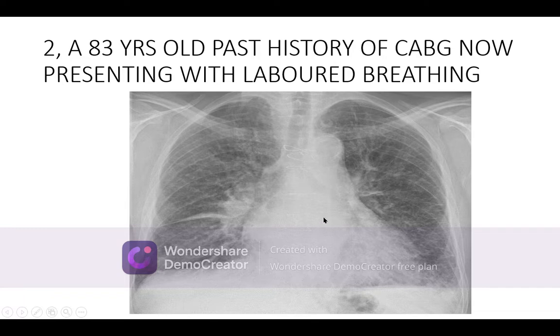It may become a complication of hypertensive heart disease. The cardiomyopathies can cause this condition. I mean to say that this is very clear cut. It is the cardiogenic pulmonary edema which is visible. Like the hilar shadows, they are enlarged as well as prominent.